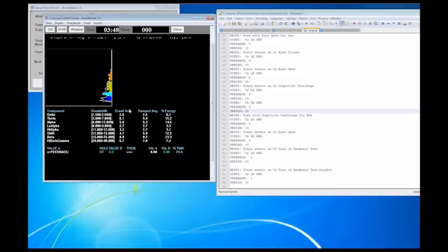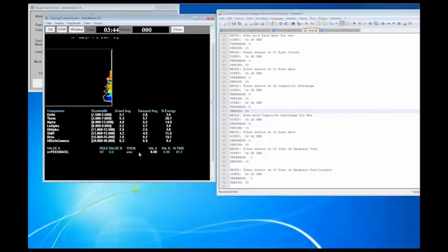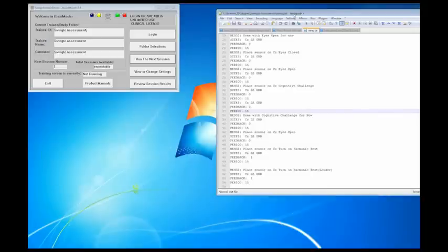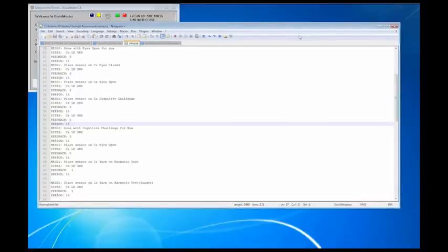Now, another thing I want you to notice is that that 1 became a 0 virtually right after. Again, you've got to ask, why is that? I'm going to go through another feature that is a very important thing that helps let you know what to do next. So if I hit yes, it's already 0. I'm going to stop right there because you've got the basic understanding of how that works. Does anybody have any questions?